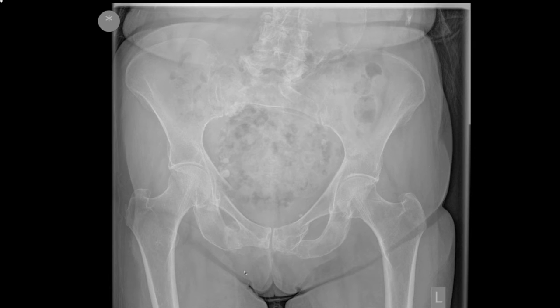So a rule of thumb that I tell my trainees is, if the clinical history is for a fractured neck of femur and you don't see one, look closely at the pubic rami, because it gives the patient pain just like a fractured neck of femur, and you can explain her pain. It is a less serious injury. Pain relief is all that's required rather than surgery for a fractured neck of femur.